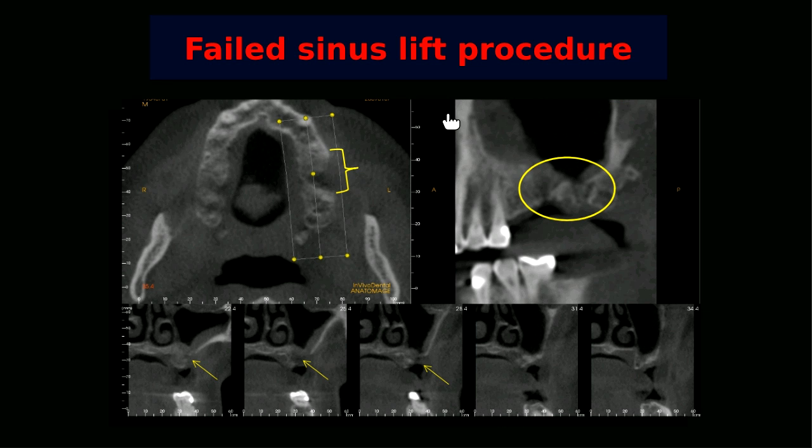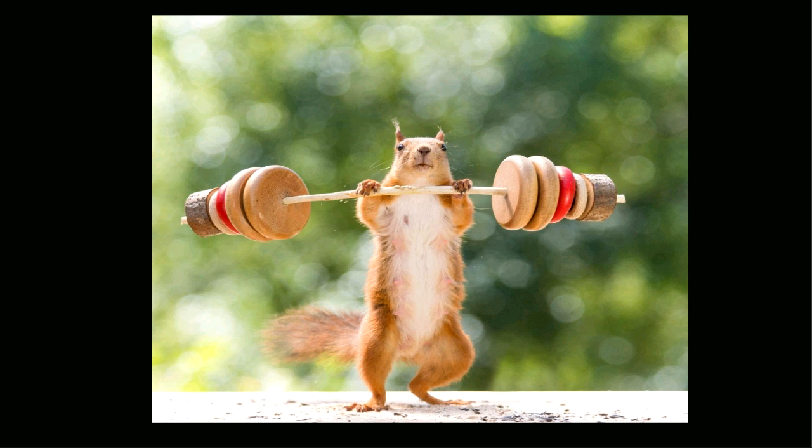If a sinus lift procedure is done, once you check it on CBCT, you can see the sinus lift is not done well. You can see there's communication from the oral cavity to the maxillary sinus. We never want to see this communication in sinus lift procedures. So you will see the inflammation, everything, even after you do the surgery. And if the patient says, oh, it's not comfortable, it hurts a lot, always take a CBCT and evaluate that area.